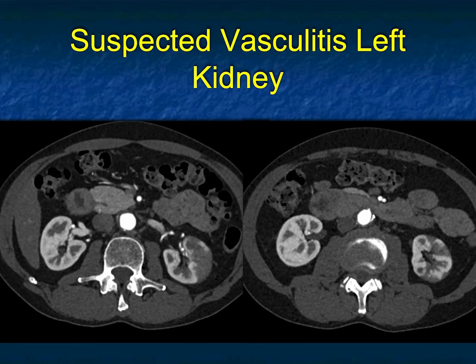Again, pyelo and infarcts and vasculitis can look very similar. If you look real superficially, the more you look with pyelo, perirenal involvement is more common. You'll get a urinalysis. With vasculitis or infarcts, you'll often see other organs involved, but you'll look carefully at the vessels.